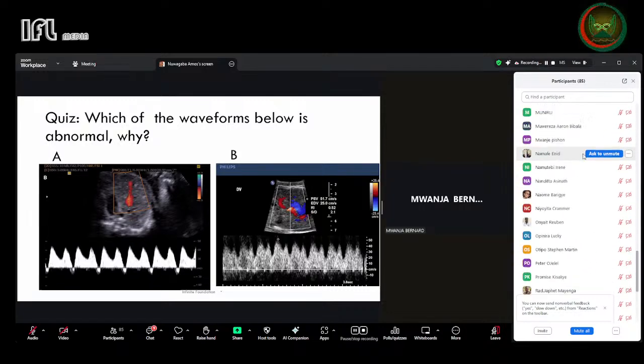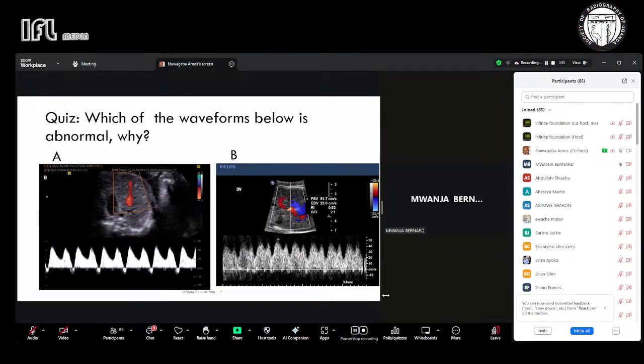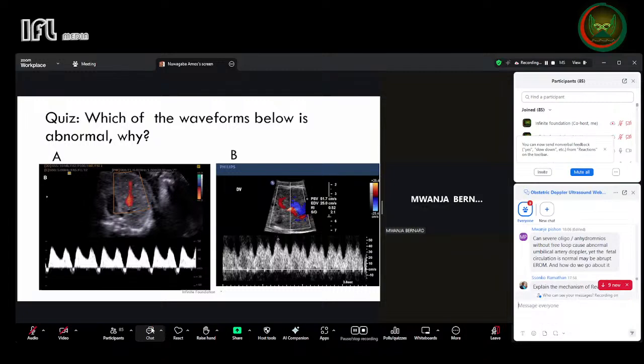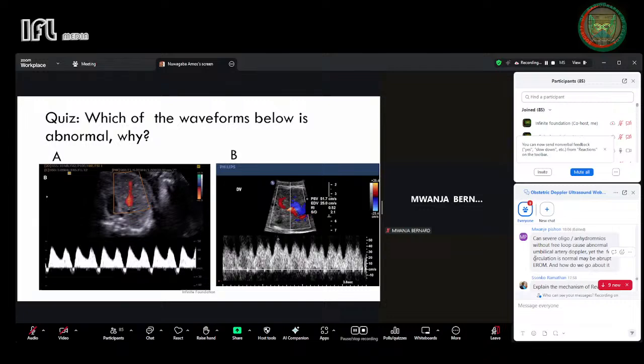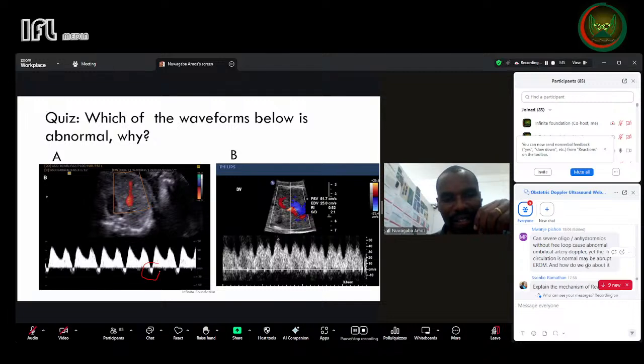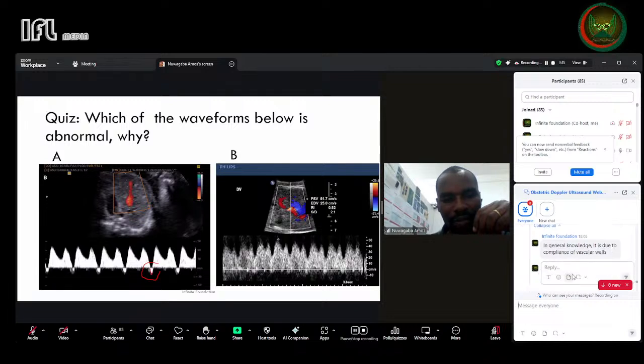From the comments I'm reading, it looks like everyone agrees with Mr. Mwanje. All right. I've not seen any answer to the contrary. Yeah, thank you very much. And I thank you, the colleague. Indeed, the A is abnormal because we see the A wave below the baseline, and this is very concerning.